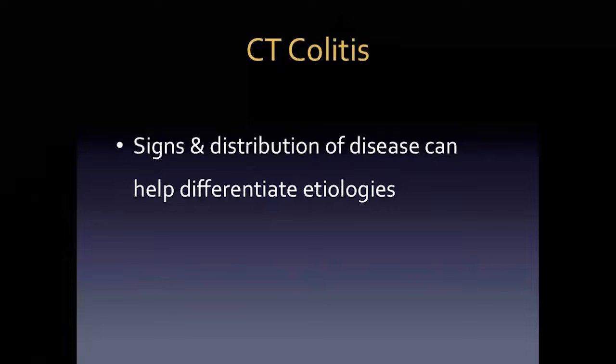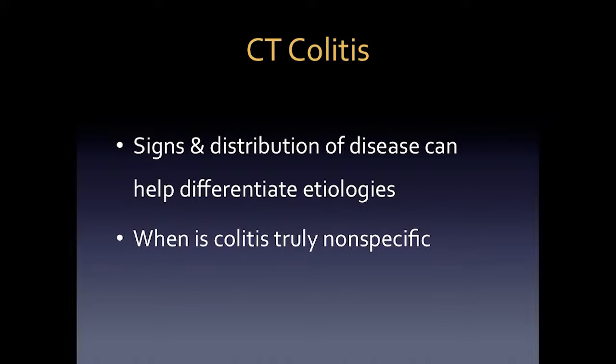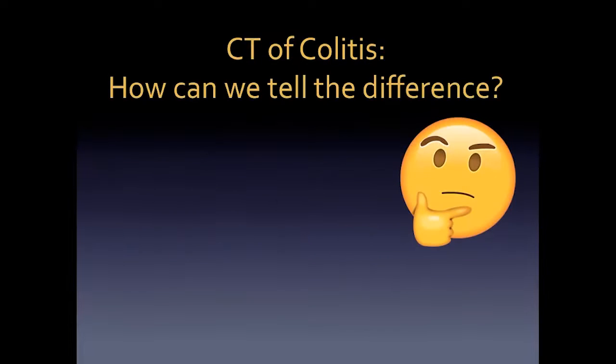However, there are signs and distribution of disease that can help differentiate between etiologies. So today we're going to talk a little bit about what those are, and conversely, when is colitis truly nonspecific? When do we have to just give the entire differential?